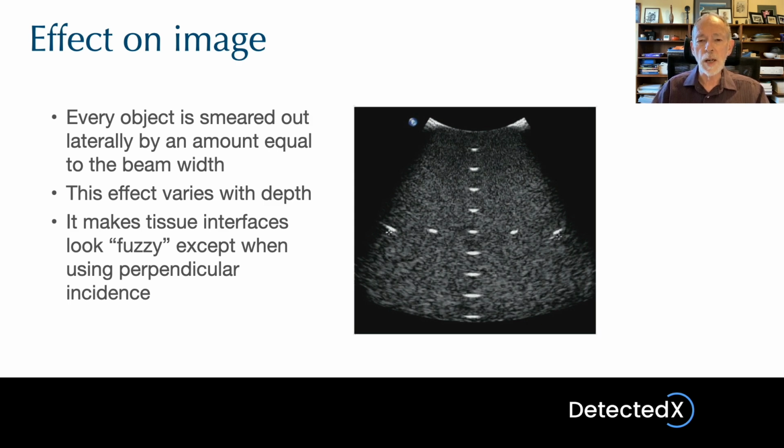Notice that the width of the lines varies, and in particular, at the greater depths, close to the bottom of the image, the length of the lines is significantly larger than further up the image. The focal point for this particular image was located at the level of the horizontal targets, so the targets that are distributed across the width, and therefore the beam is narrowest at that particular depth.